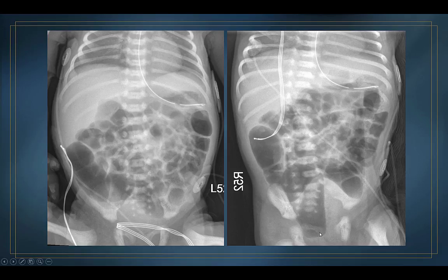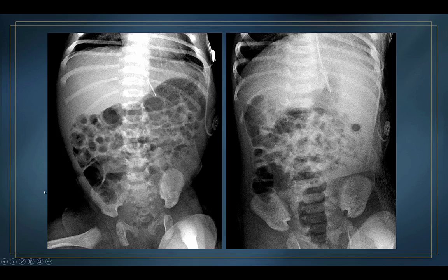It shouldn't confuse you. Well, again, this is kind of an awful X-ray because it's just so grainy. But there is a more dilated loop of bowel seen in the right lower quadrant, which on the decube pretty much has to be the sigmoid because of a lot of that air that has now risen into the rectum. So this is a relatively nonspecific gas pattern.